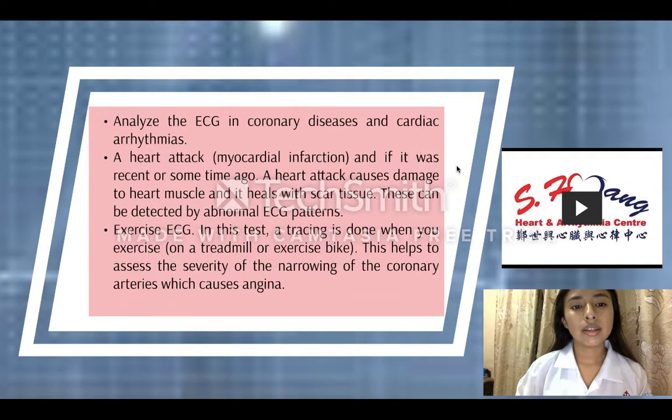Analysis of the ECG in coronary disease and cardiac arrhythmias can reveal a heart attack, myocardial infarction, and whether it was recent or some time ago. A heart attack causes damage to heart muscle and it is replaced with scar tissue. This can be detected by abnormal ECG patterns.